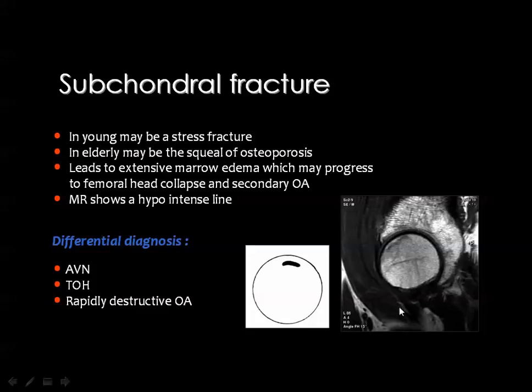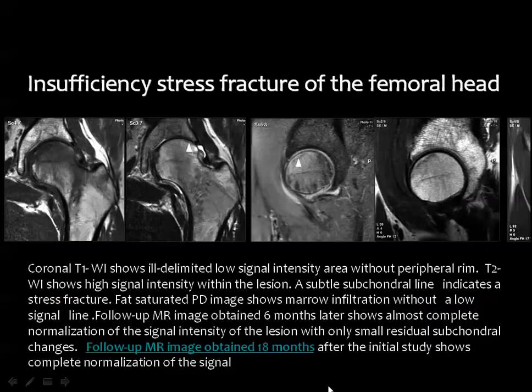Then be careful about this, and this fracture is usually, as I have said, parallel to the femoral cortex, and this fracture on follow-up will show total resolution.